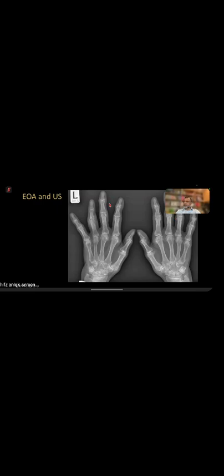Now look, one more example. There is typical osteoarthritis, maybe subchondral cyst formation. Look here, the joint space is gone on both sides. It looks like there is possibly some infection. But now we look at the previous X-ray of a similar patient, showing progression, and now there is erosion because pannus, or synovial hypertrophy, or inflamed synovium has eaten up the bone. Normal osteoarthritis led to synovitis, and that has produced these erosions. Look at the synovial thickening there.